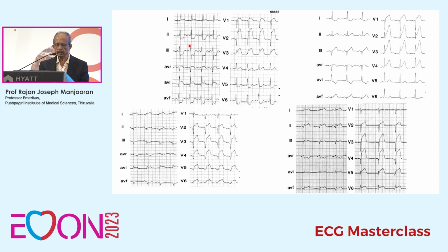So if you look at here, this patient is having ST segment elevation in AVL. Is it clear? Is there ST segment elevation in AVR? It's clear? And so, where is the occlusion? It is proximal to S1 and D1. And there are some additional points that you can look at. These patients usually will have ST segment depression in V5 and V6. It usually indicates an extensive myocardial ischemia.